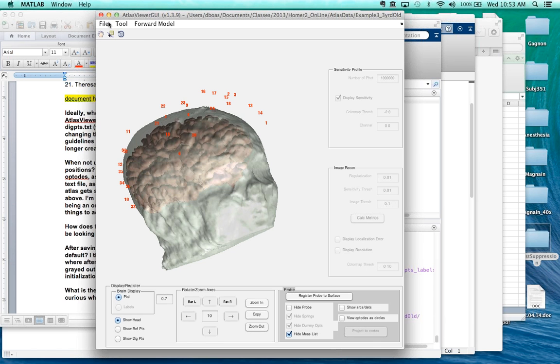I don't understand. So first, just for everyone else, you can save your viewer state, and that way, if you save that and then close it down and reopen it again, it will come back to where you were. But you're saying you're messing around, and you aren't able to get back to where you started. Yeah, I think it might have something to do with dig points that aren't very good or something like that. So it may just be something that I can't quite reproduce. If I do reproduce it, I'll send a note specifically. Great. Thank you.